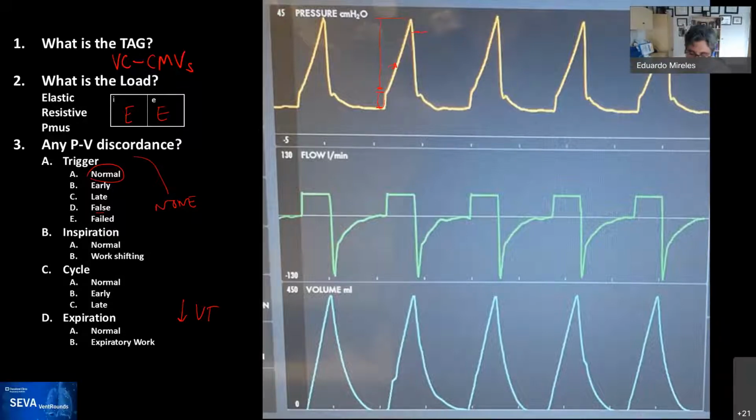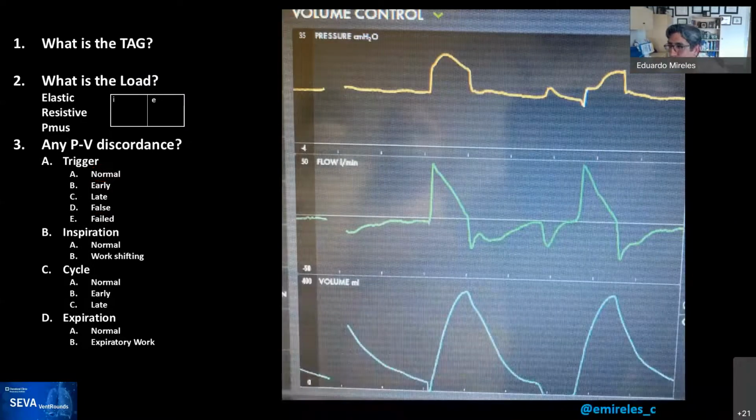Very good. All righty, thank you, Udi. Good observation. Trying to minimize the strain that these lungs are getting. All righty. The next one is a little bit harder. This one is a live one. I put this one as the teaser for Twitter, but it occurred, and I left a little bit of the mode there. I want to see if anybody of our fellows wants to jump in.